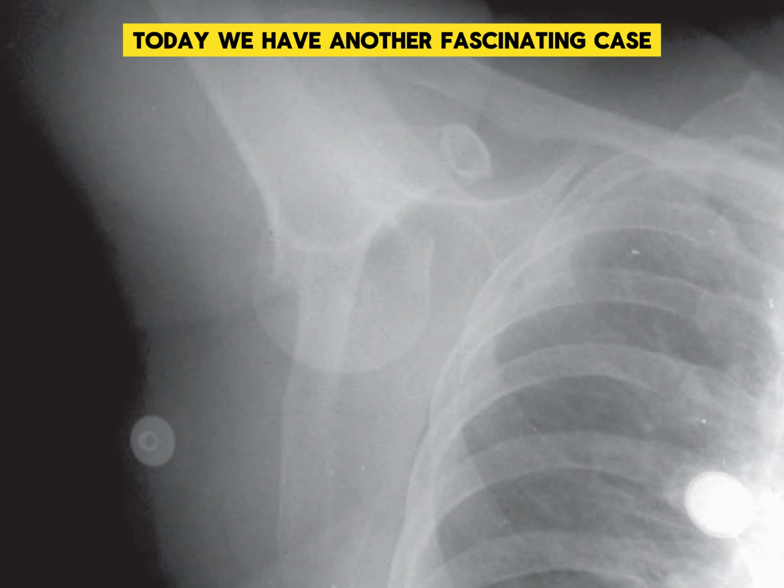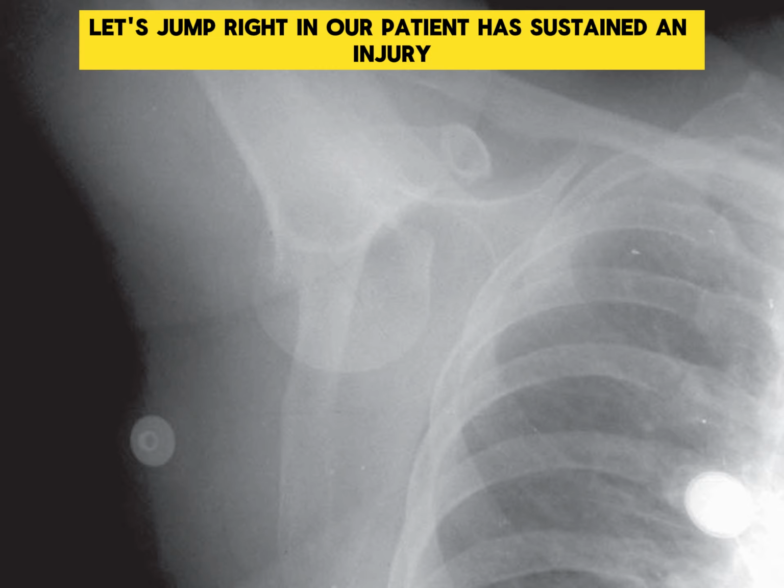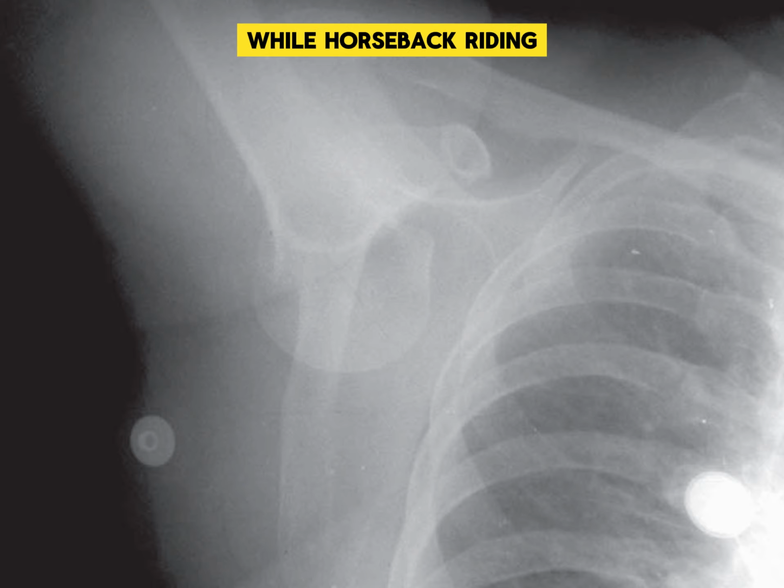Today we have another fascinating case to test your diagnostic skills. Let's jump right in. Our patient has sustained an injury while horseback riding. Let's examine the imaging findings.